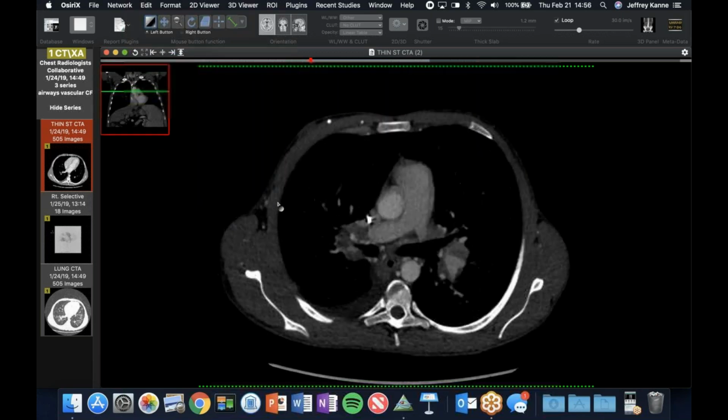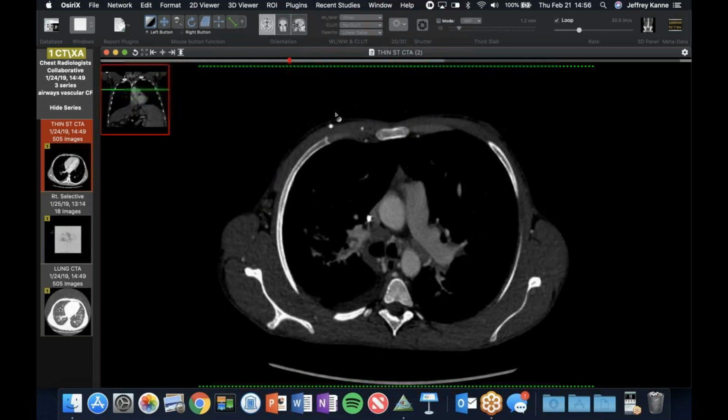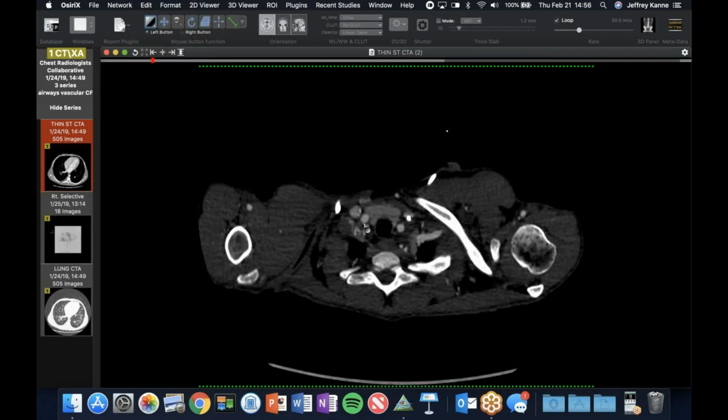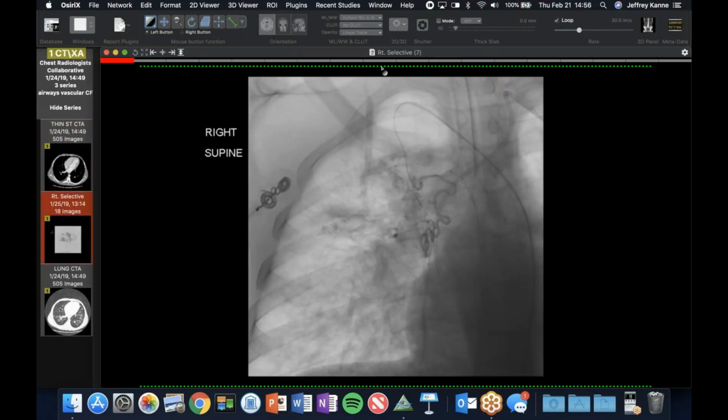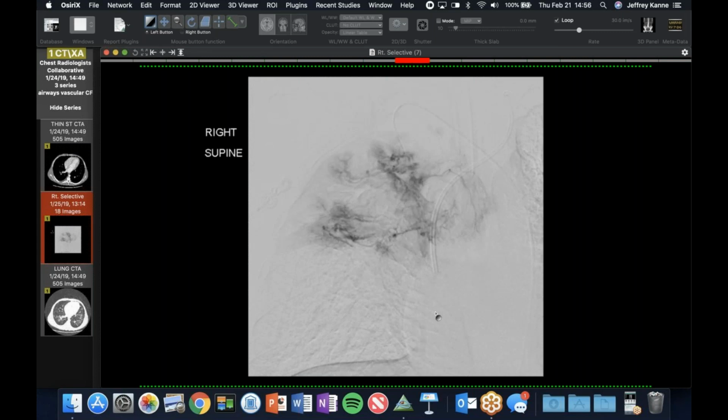That's a good question. That looks like shunt tubing. That looks like a VP shunt or something over there. Yeah, that's a fragment of a shunt, but this looks, maybe that's what that is, or I don't know what that is. Unfortunately, I didn't have a radiograph of this patient, so never got to figure it out. I was just curious, because sometimes... Yeah, there's the shunt fragment. There's the shunt fragment there. Yeah. But yeah, there's a central line in, but I don't know what that is. I think it's a calcified VP shunt.